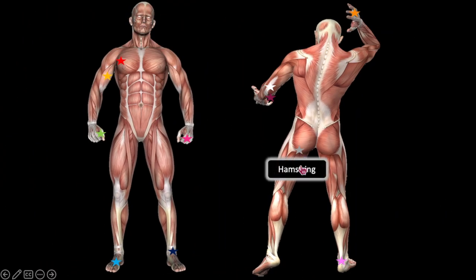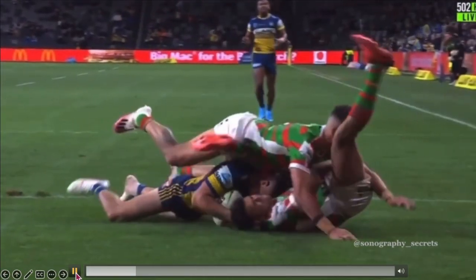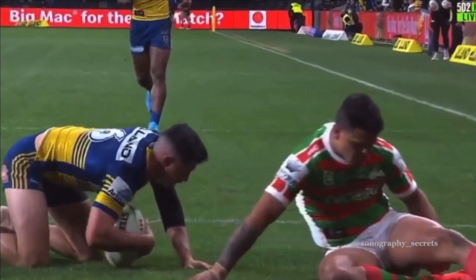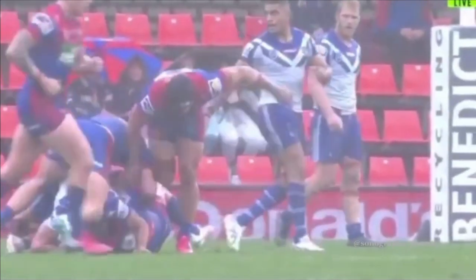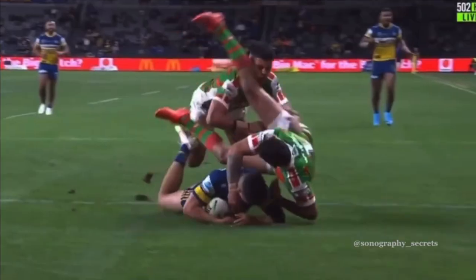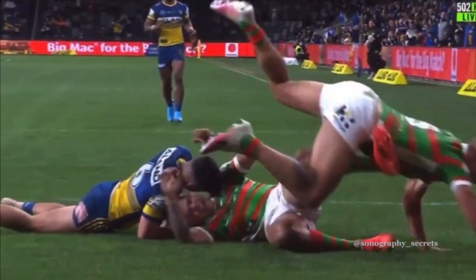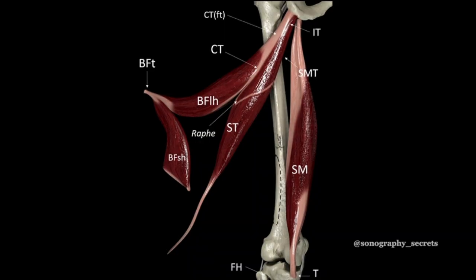And lastly, hamstring ruptures. Hamstring ruptures are caused when the leg is forced into extension. So you can see that Latrell Mitchell and Andrew McCulloch overstretch their leg, resulting in a hamstring rupture. Now, in the general population, this will generally occur when someone has slipped on the wet bathroom tiles. Now, scanning the hamstring requires a methodical and systematic approach.